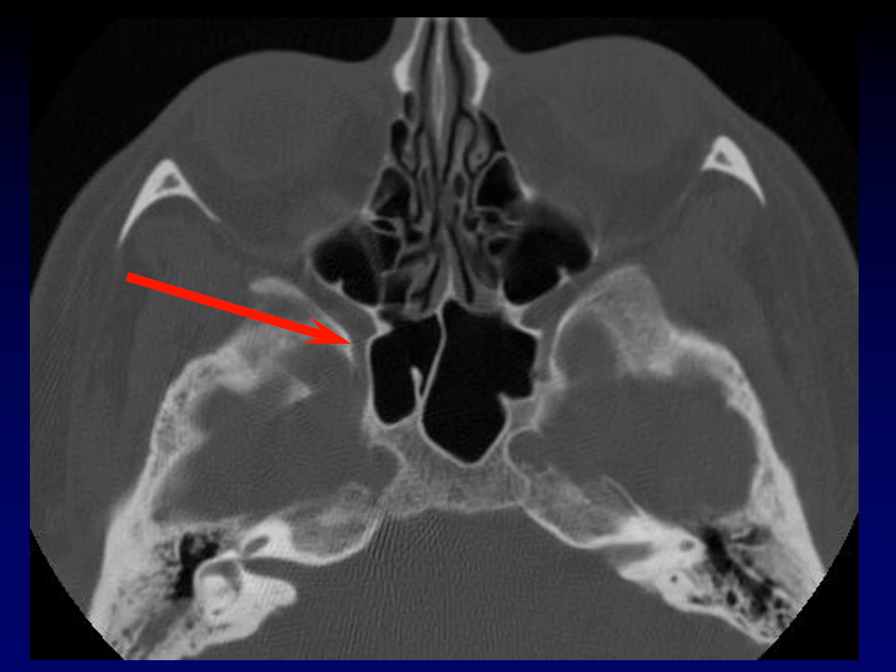Here's another axial image, a little bit more superiorly. This short, blunt object, a little wider, that is foramen rotundum. It's carrying V2. Notice that it's not going into the pterygopalatine fossa. We're too high up here. We're going into the inferior orbital fissure right here. Okay.